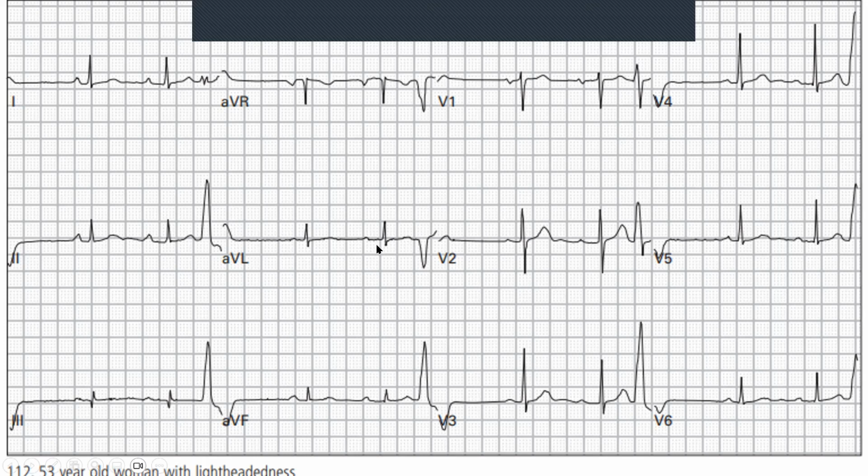All right. Okay. So if the PR interval is lengthening, is becoming longer and longer, there's only one heart block that does that. That's Mobitz type 1. But we're going to discuss all of them just now, right? So this is a Mobitz type 1. But what's more interesting in this one is these beats that are coming out.